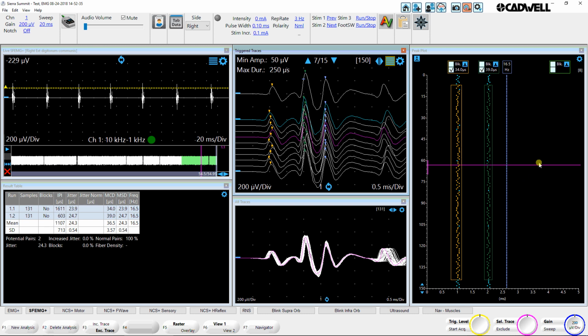If you saw blocking in a particular peak, you could just click the box blocking here. If you're using reference values, we'll be detecting blocking automatically. If you're not using reference values, you'll need to check that box when you see blocking in a particular peak.